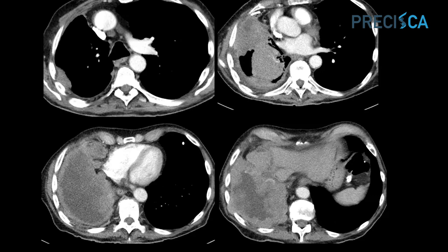Some of the things that I think are very useful are to remember that the lung is surrounded by pleura, and the pleura can be a visceral pleura when it's attached to the lung itself, and parietal pleura when it is against the chest wall. Very useful in practice is to look at the medial pleura. If you can see nodularity along the medial pleural surface, that's very unusual for an inflammatory process. It's much more typical of a malignancy. So when we see medial pleural involvement, all of a sudden our antennas go up and we get very concerned that we're dealing with malignancy.